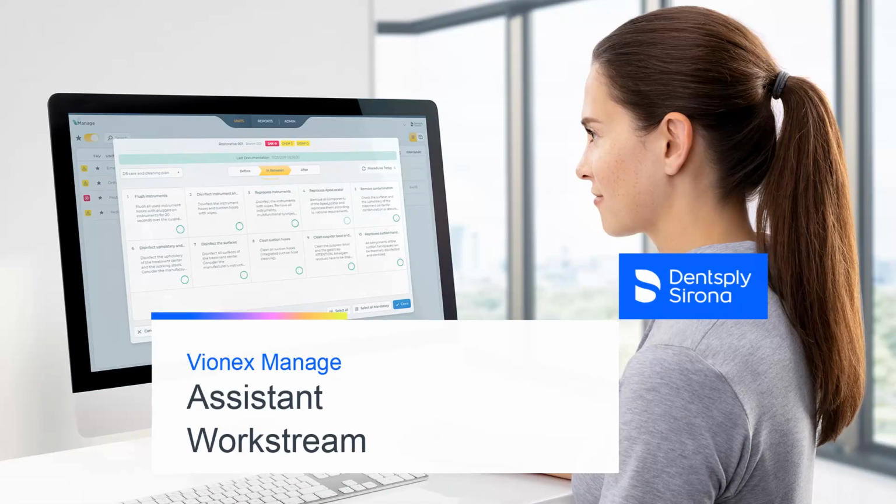Welcome to this video tutorial on the topic of Vionex Manage. In this video, we will demonstrate a workstream for a dental assistant and explain the central functions that are relevant for working with Vionex in everyday clinical practice.